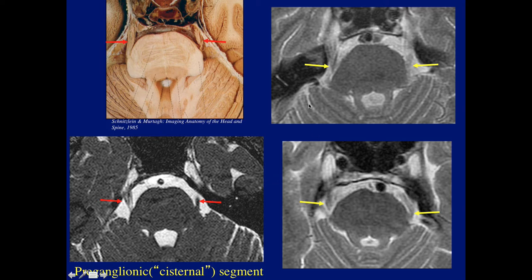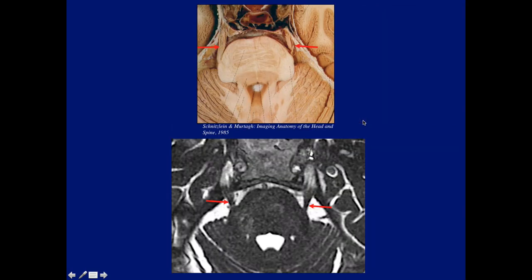Now, if you look at these images, it's hard to see the entire trigeminal nerve on both sides. We see all of it here, part of it here, and part of it over there. I wanted to show the entire nerve, so last Thursday when I was at the VA, I found this case, but the regular image did not show both nerves adequately, and I had Pradeep reformat it slightly, so both of them show up nicely here, the full cisternal course.